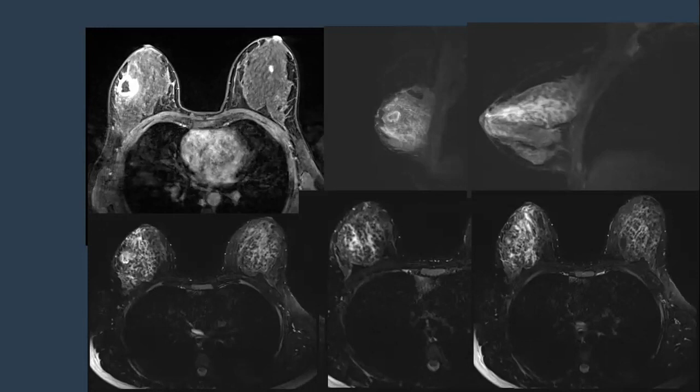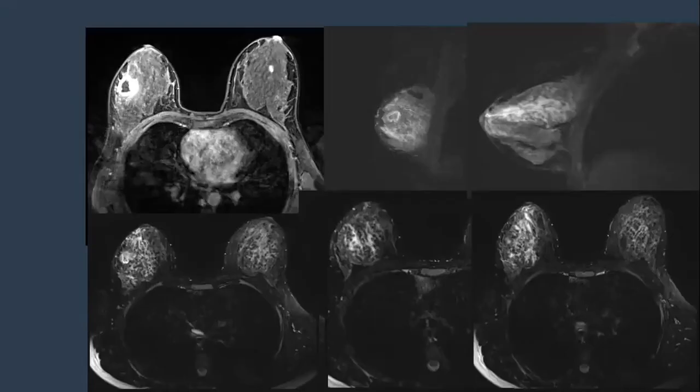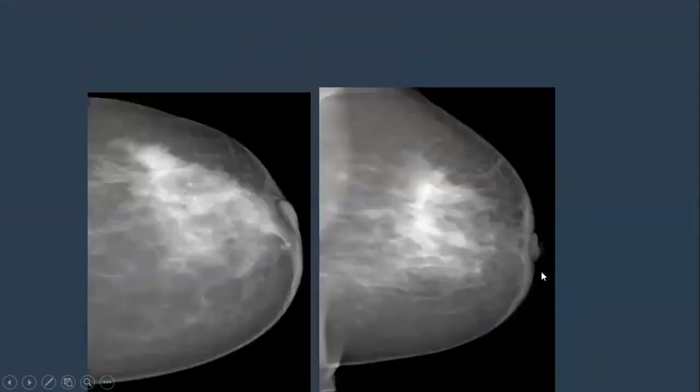But if you look at the ultrasound, the lesion seems to be not midline, not exactly central. Look at the cursor, and even here on MRI, a little bit off midline. And look for the edema, and look for the segmental ductectasia, and the surrounding edema on T2. Okay.